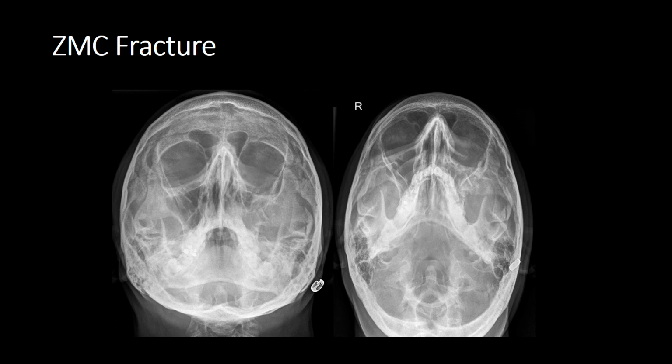Okay. Do we have a teardrop sign on the left? No. Can't really see what's going on here at the moment. Number 3. Down the inferior margin, down the lateral margin of the maxilla, over the alveolar ridge, and through to the other side. We can now see lots of increased density. There is disruption to the lateral wall of the maxilla. So we've got a 4th injury. So this in fact involves all the way through the maxilla.